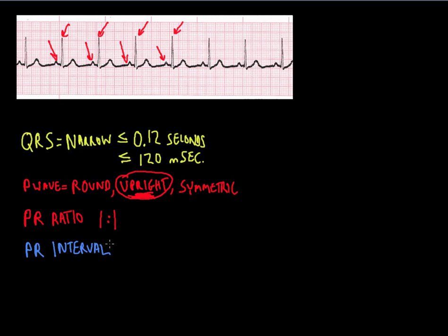And while we've got the rhythm up top, I'm going to draw an example of that over here. So if I have a single heartbeat, we have several different components. Actually, I'm going to redo that. So we've got a smaller P wave here. Nice big QRS, almost starting to look kind of wide. But let's make this T wave a little bit more prominent. That's almost a dangerous T wave, but anyway, that's for another day.